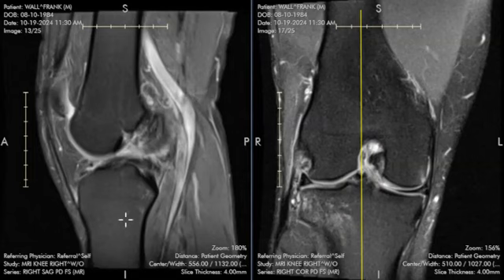Before I go into each of the findings, I just want to say from the outset that there are several injuries on your exam that are not likely to heal properly on their own without the intervention of an orthopedist. So my recommendation is to make an appointment with an orthopedist. They are a specialist type of doctor who deals specifically with issues related to the joints, especially complex issues.